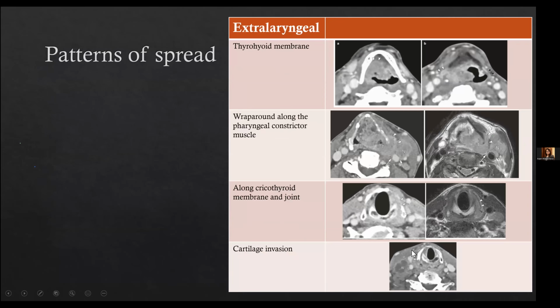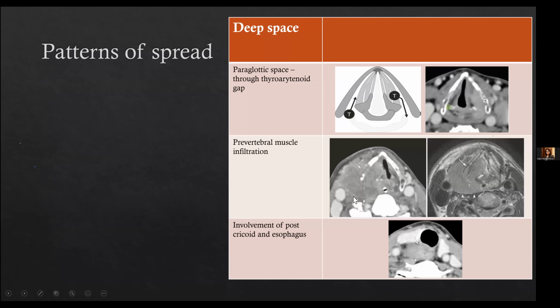But if we do MRI in such a case, this is the same case we see here, the prevertebral fascia is very nicely seen and the prevertebral muscles are quite clean. So in these two cases, MRI is very helpful to us. Very rarely, we can use it in vascular involvement, but generally these are the two main indications where MRI is used.